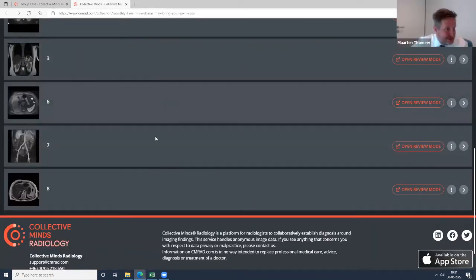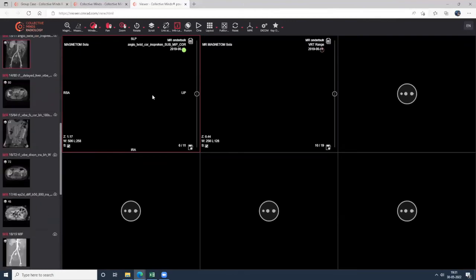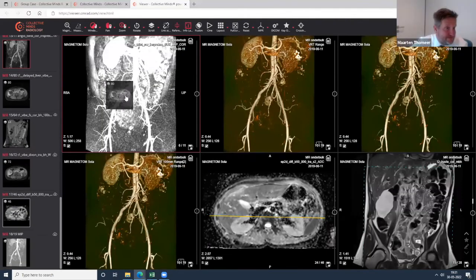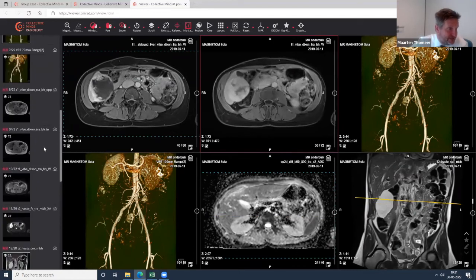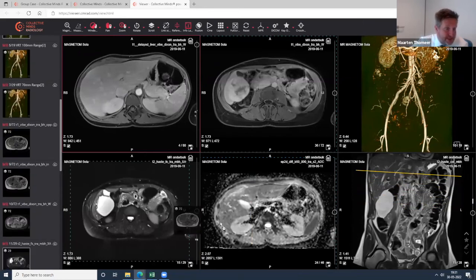So next case, this one. Actually, this was an exam set up for an MR angiogram. And so we had a coincidental finding in the liver. One of the most common coincidental findings in the liver are hemangiomas, apart from cysts. This looks like a normal liver, as you can see. And again, the in and the out phase, I put it here.